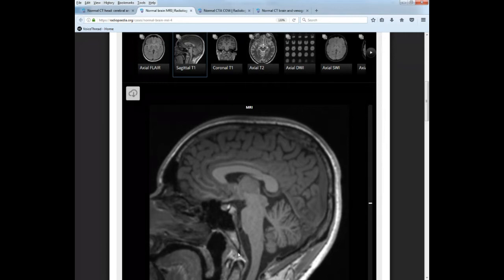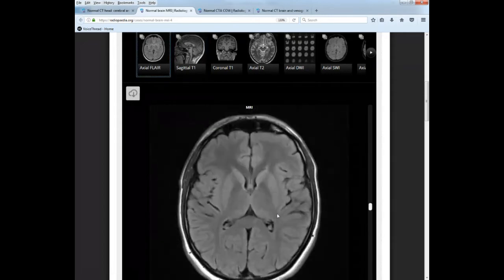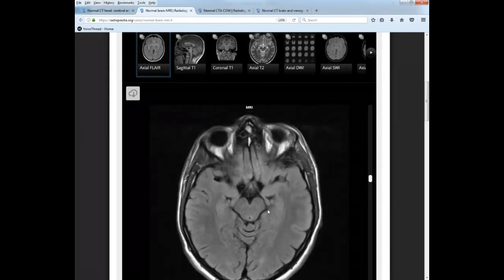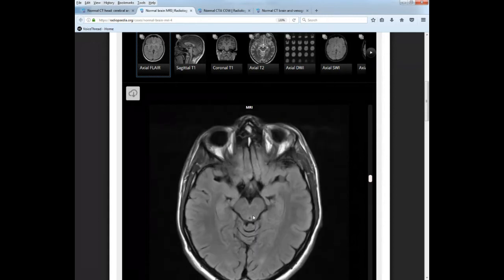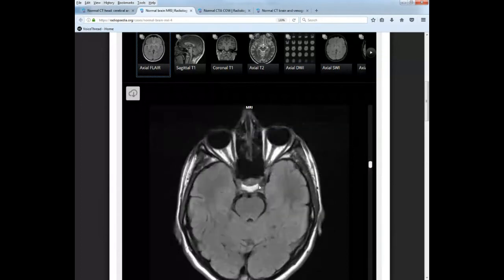These I will have you know in a sagittal, and then let's go over and look in an axial. It's going to be a little bit harder in axial, but I'll walk you through it. So in the brainstem, first thing I want you to do is look for Mickey Mouse. You see Mickey Mouse right here. You want to go 1 slice above where Mickey Mouse is, or 1 slice below, whichever. It's going to help you see where you are and get your bearings.